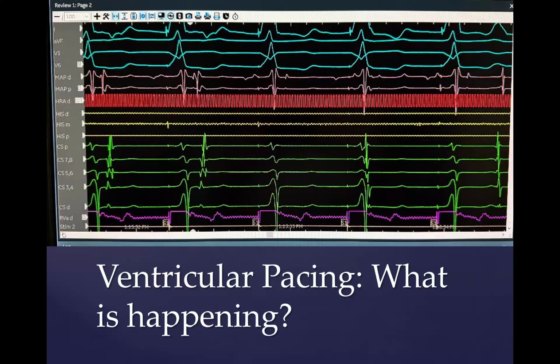And so, to rephrase that a little, this is so-called eccentric retrograde conduction. It's eccentric because the earliest A is not in the coronary sinus or the His pair. Of course, there is no His in this tracing. But it is eccentric because it's earliest in the left lateral position here. I might add the pathway was ultimately determined to be between pairs 3, 4, and distal, which would make sense based on this pattern here.